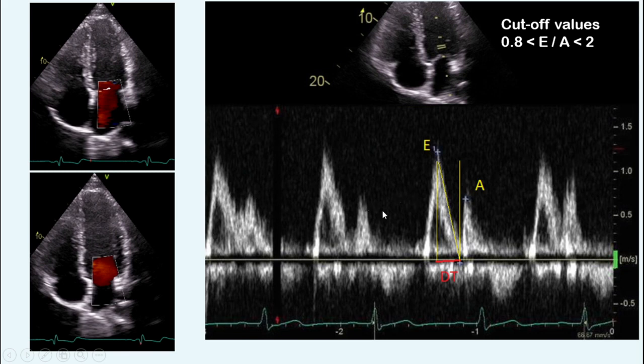We go and find the one that has almost average shape and has a clear, strong border, and is not at the PVC extra beat or the pulse right after PVC. We don't measure those spots.